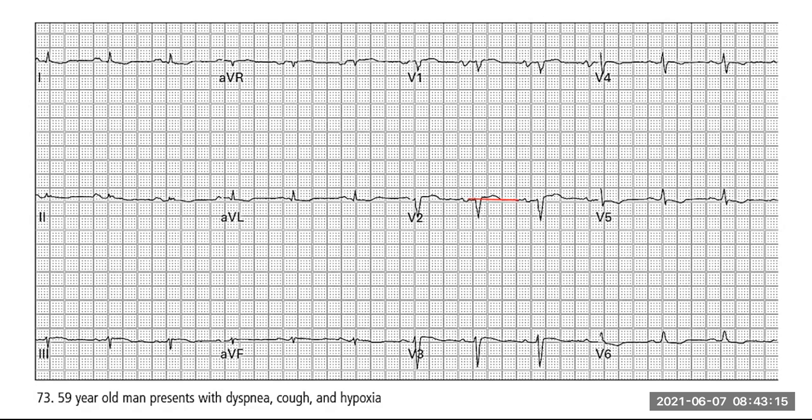Okay, he's not tachycardic, but he is 59 years old as well. Could have primary cardiac disease that we don't know about. He's got widespread T-wave inversions and flattenings. He's got an incomplete right bundle branch block. He's got evidence of a P mitrale over there. So there's quite a bit that's going on. Would we be shot at if we took D-dimers? Nobody would shoot us. Agreed. If you take D-dimers for somebody with a broken toe, people will come and ask you, what the hell are you doing? But if you did D-dimers for this patient, nobody would say no.